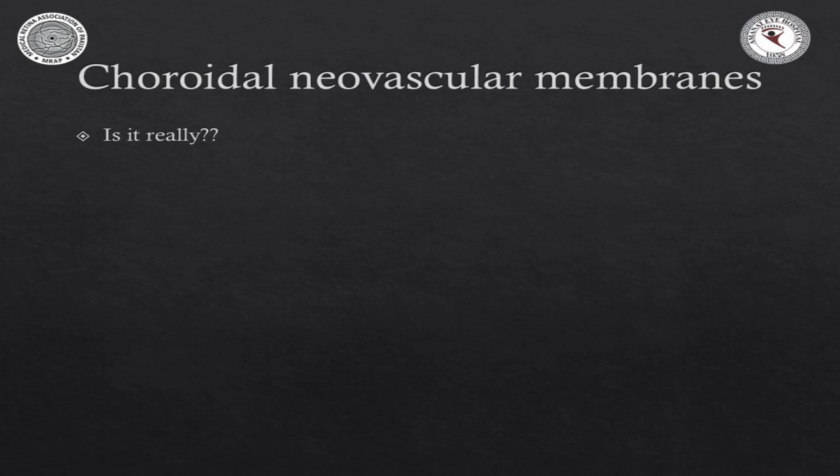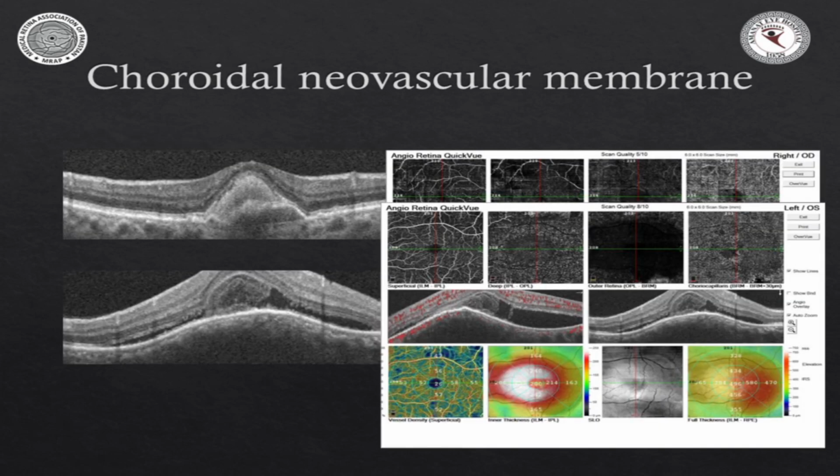This later turned out to be a patient who was a known case of renal cell CA and had now had metastasis in the choroid. So the choroidal met was actually causing the fibrinous CSR on top, and it was being misdiagnosed as CNV. Again, when we did an OCTA, there was absolutely no flow within what seemed like a CNV, but it wasn't.